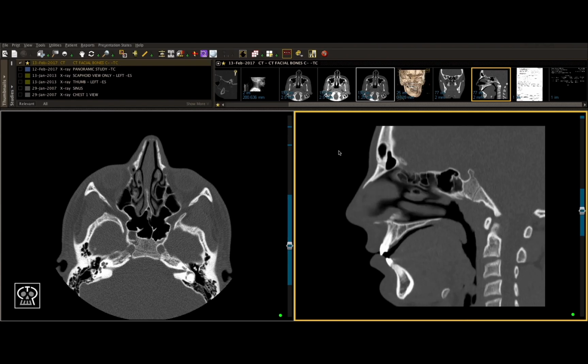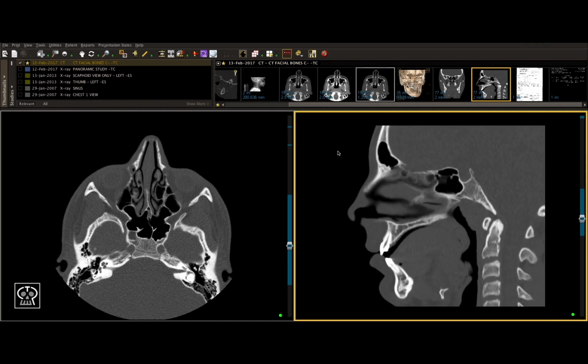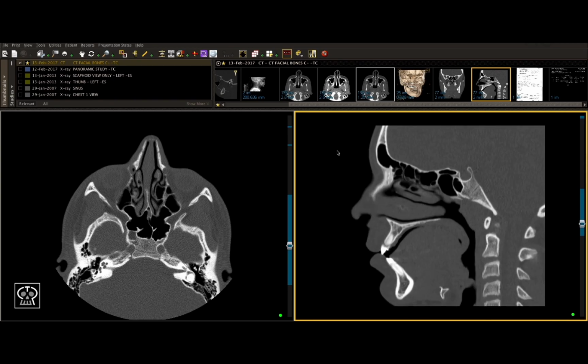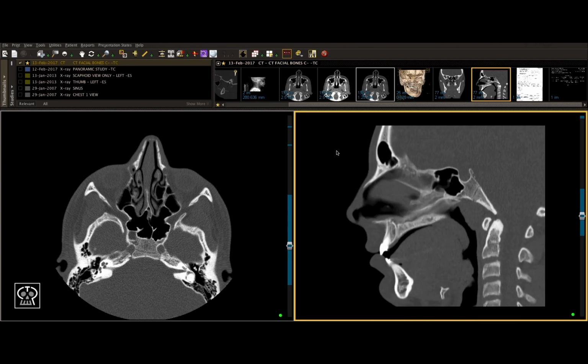As you scroll through the sagittal scan, you're able to look at each nasal bone one at a time from a sagittal point of view, and this will help you get some complementary info on where the bone is fractured and where it is displaced. The most important thing when it comes to nasal bone fractures is to remember your normal anatomy and those normal suture lines and not to confuse them for a new fracture.